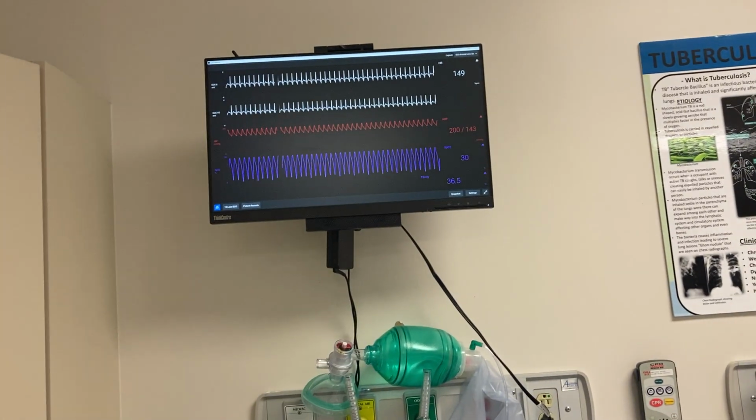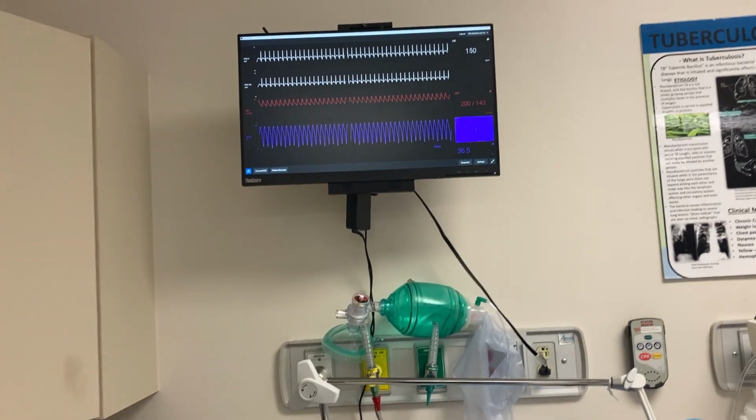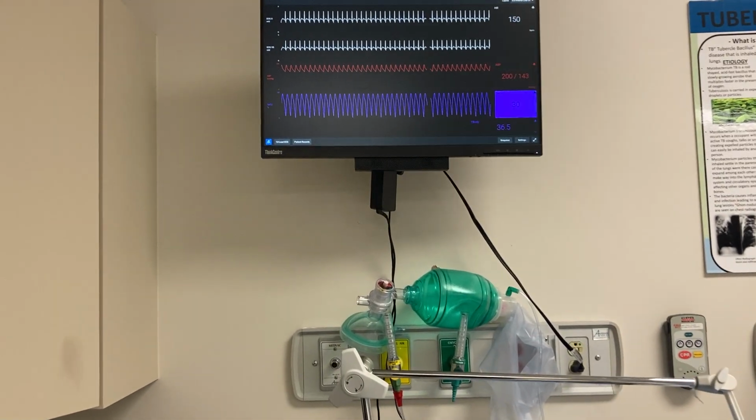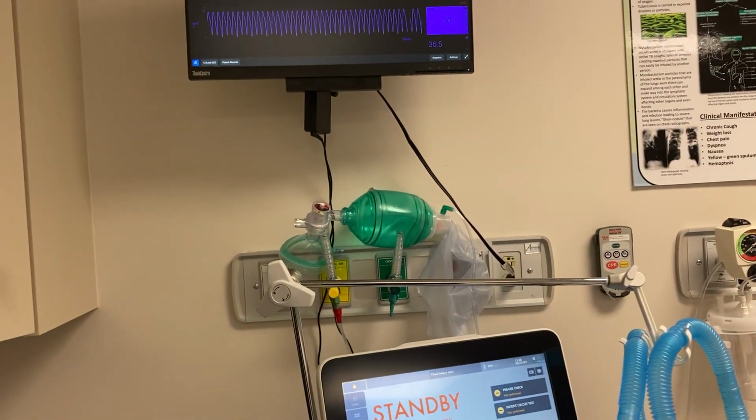Now I know that that's showing 30%. I've not addressed it on the mannequin, but I just wanted to show the importance of being aware of your surroundings, aware of monitoring, and don't forget there's a patient attached to these monitors.